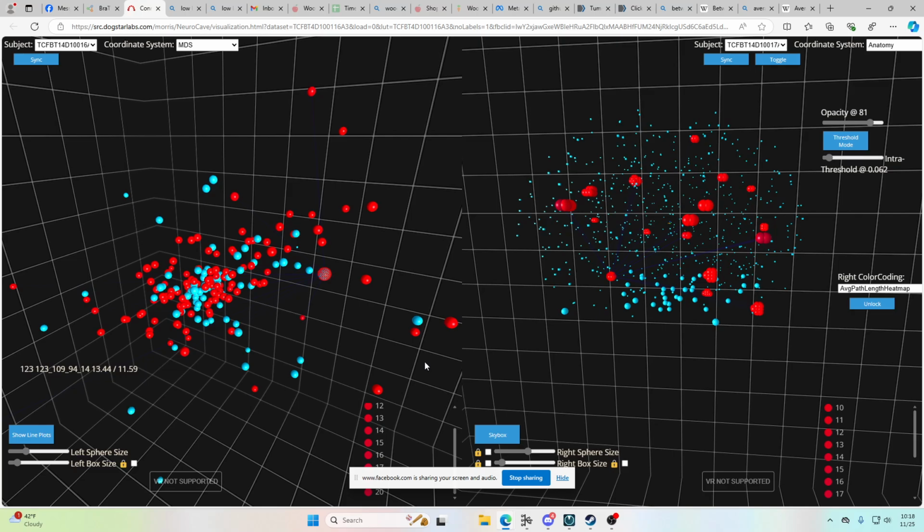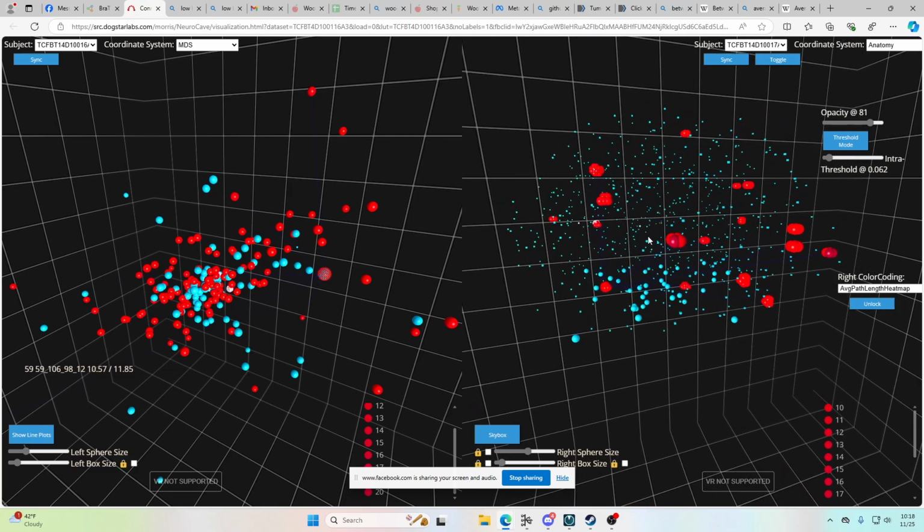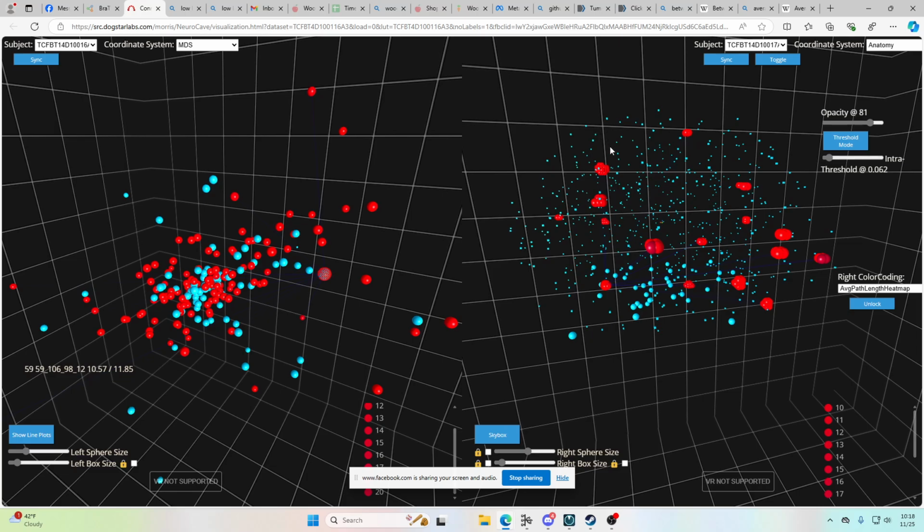We did have protein data. The different samples weren't necessarily from the same patient, but can you relate the tumor connectomes to molecules? Maybe.